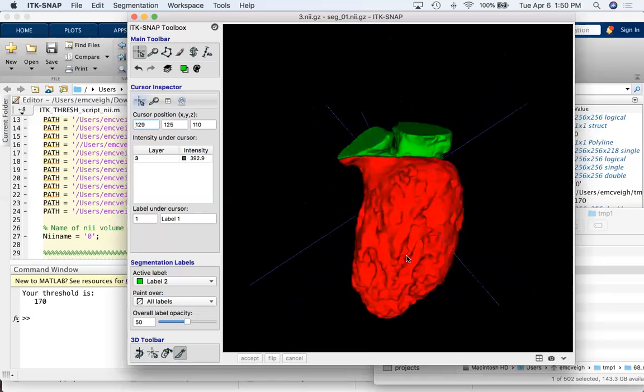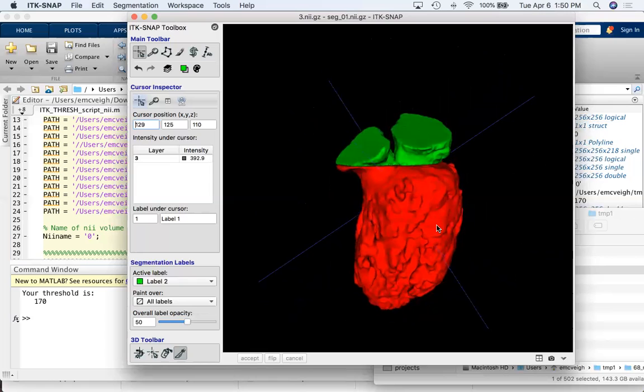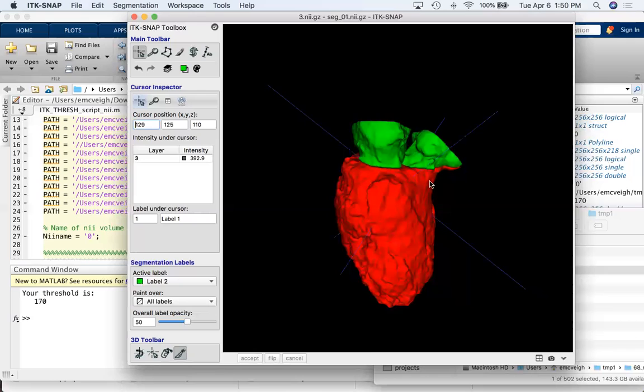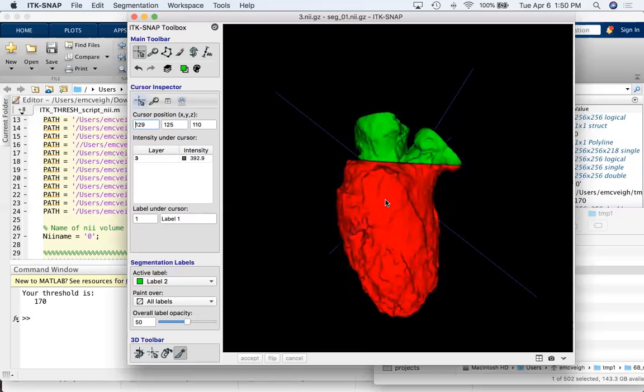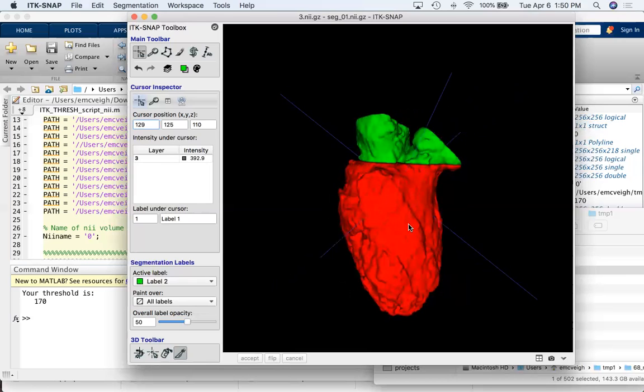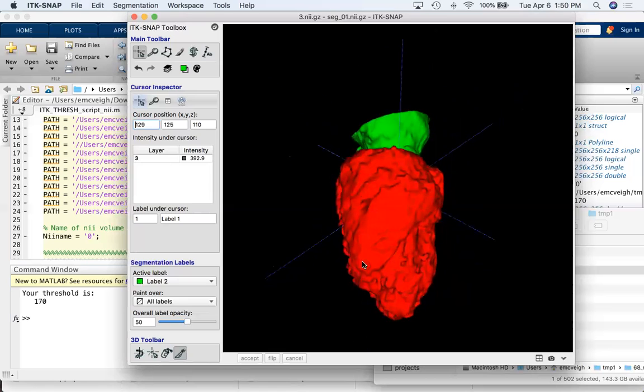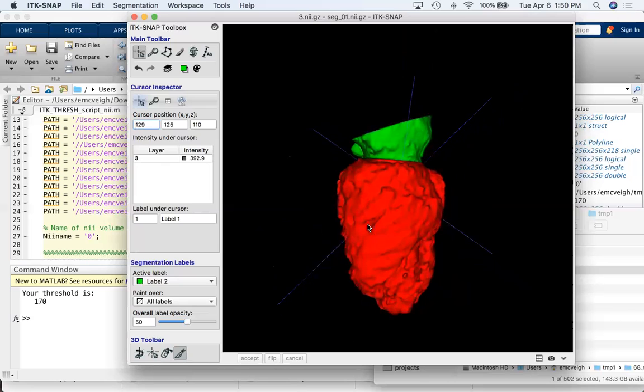Okay. Yeah, it's hard for me though to set a good orientation of the heart. Oh, you know what? I would either pick this orientation where you're looking between. No, the thing is, I cannot get it moved to that. Why? I don't know. Well, I guess it's a matter of rotating more and more. If you need it, you know how this works. It tilts this way. And then if you need to tilt the other way, you tilt this way and then do the rotation, right?